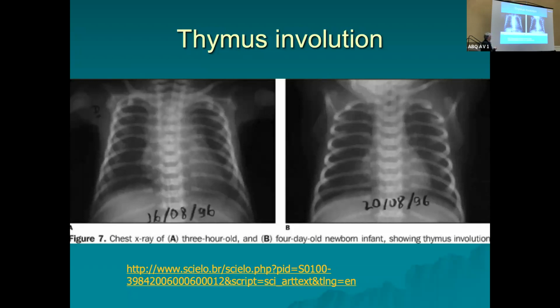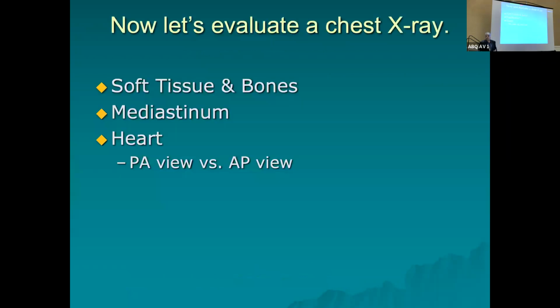Here is day 1, where they're just 3 hours old. Here you can see on day 4, completely non-visible. Now it's there, you can look for it, and you could probably make it out, but you can see how that thymus really sucks down. So I tell you that so when you're looking at a newborn, you don't confuse the thymus with the heart.